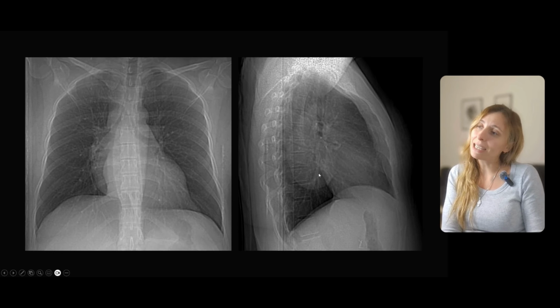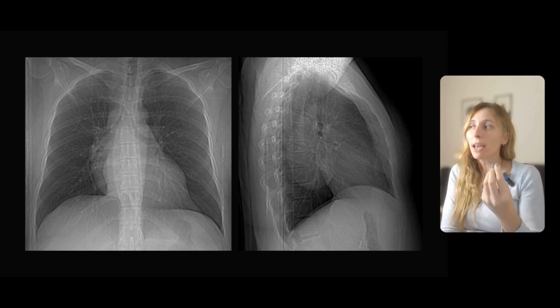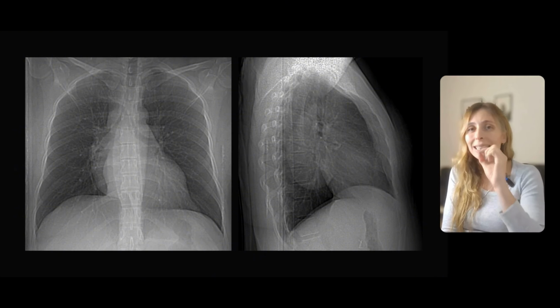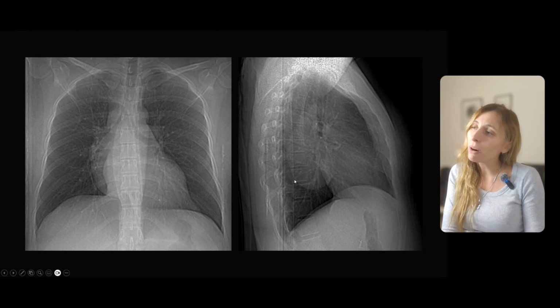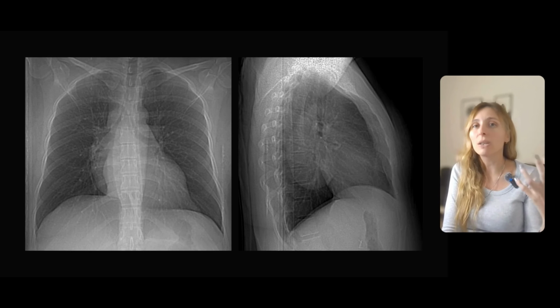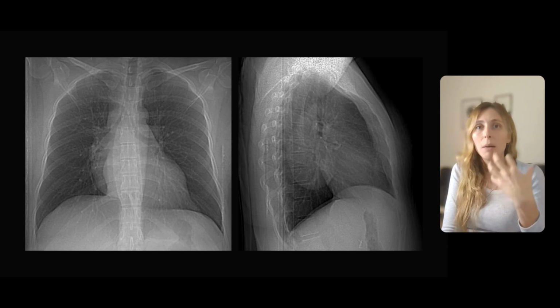We can see that this is in the middle and posterior mediastinum, and we can think about an extrapulmonary lesion because we can distinguish the borders of the lesion so perfectly, so well defined, so smooth. If this lesion originated in the lung parenchyma, maybe this perfect border is not a finding that we are expecting to find. So we think, we already know because we saw the cardiac MRI, but we think we are talking here about a mediastinal lesion.